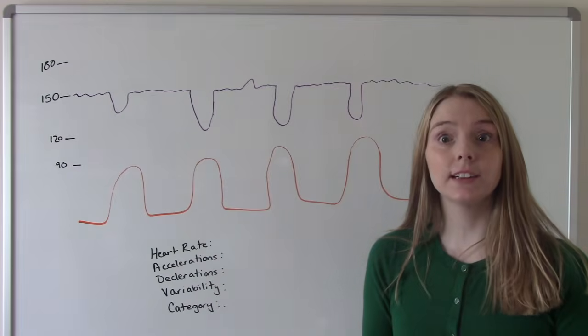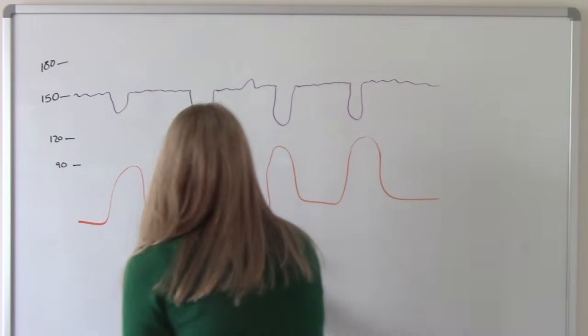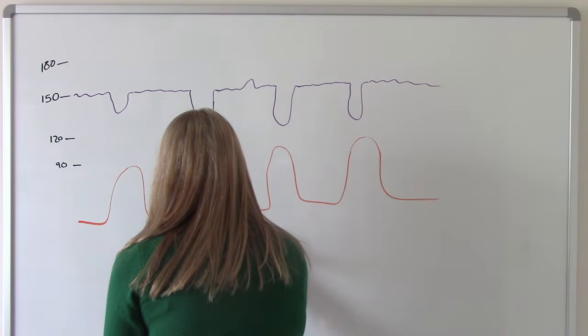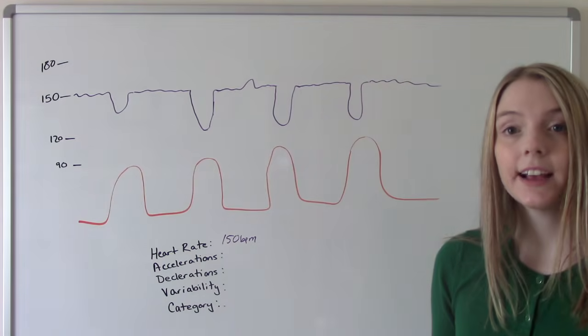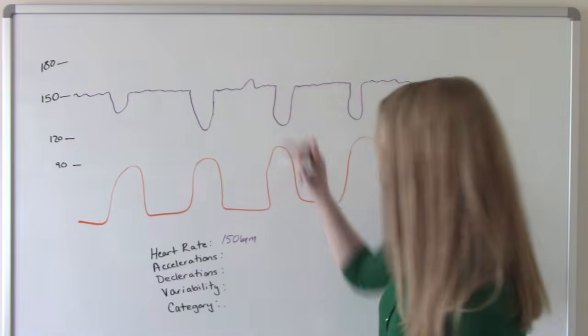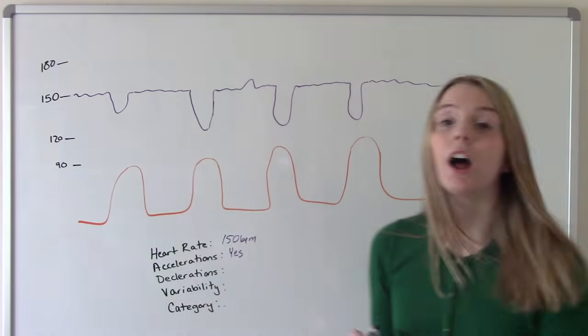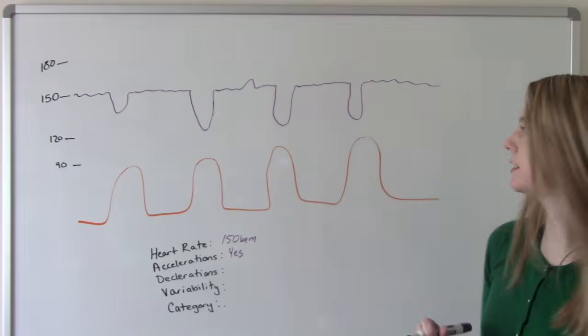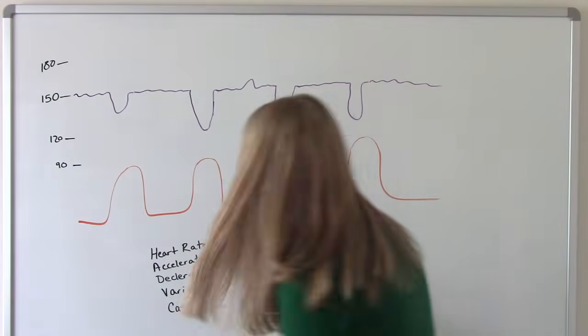All right, let's take a look at this one. Our heart rate is 150. Are there any accelerations present? Yes, there is one. There's one right here. Are there any decelerations present? Yes, definitely. And then what kind are they?